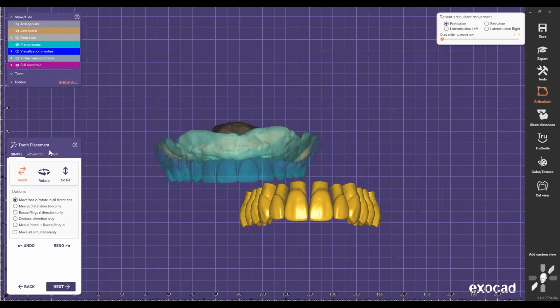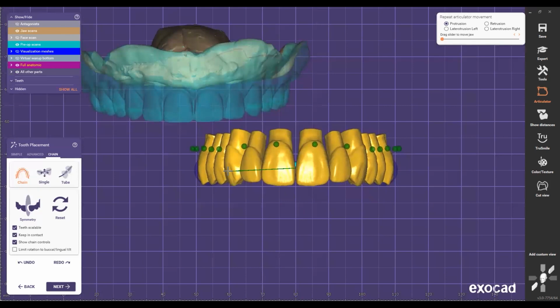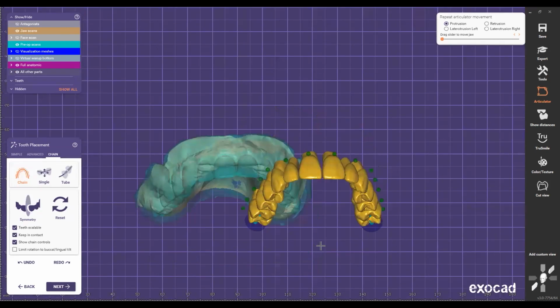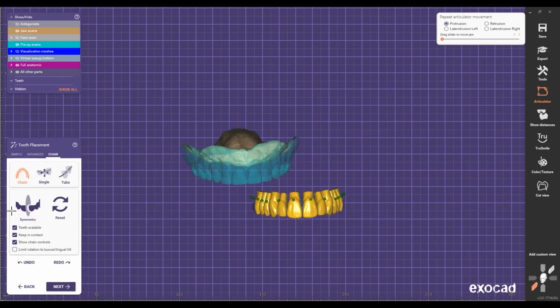The only thing I need to do is go to chain mode, and these teeth by default come in kind of like 10 point something. Those are too big right now. So I'm going to scale everything to be like 8.5, somewhere there. So this is 10, so 8, 9, pretty much 8 right there. That means that's going to be my ideal width and my ideal height, so I don't have to worry about scaling two by two because I want to preserve that dimension all the time. So that's one thing you can do.